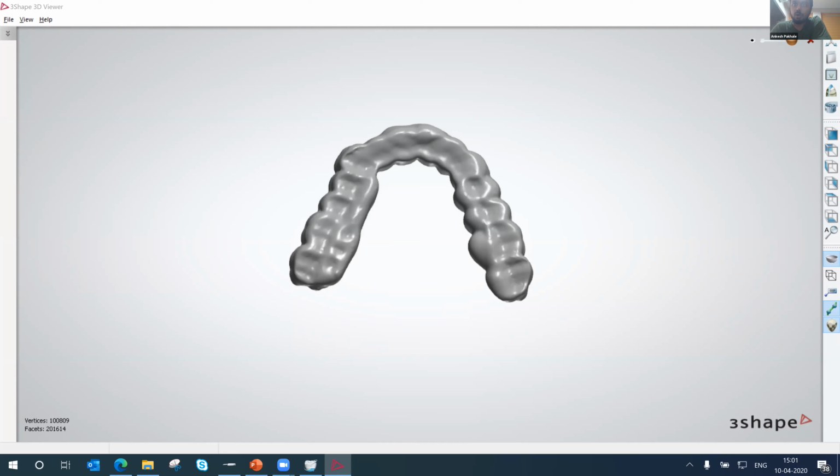It's very important to block out the papilla inside. Yes, it's actually important if those areas are sensitive. Thomas, you said it correctly: it's important to block out the incisor papilla, because those might be sensitive regions and might affect the patient, might cause some severities.